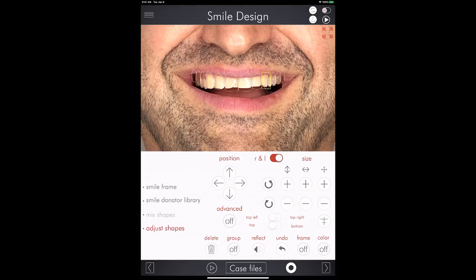That means that my buccal corridor from the left side is too lingual, it's too in. So my arch is not symmetric. Now you can see and analyze the situation of your patient, and then you can also visualize and discuss the treatment with your patient.